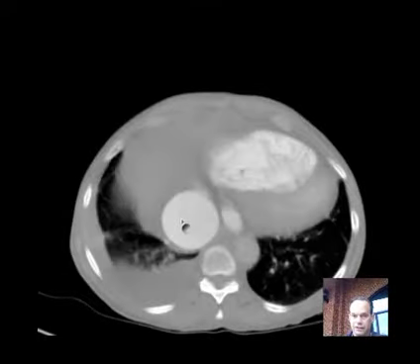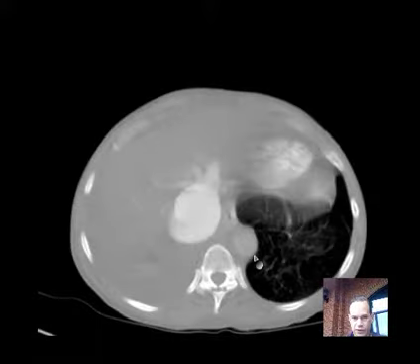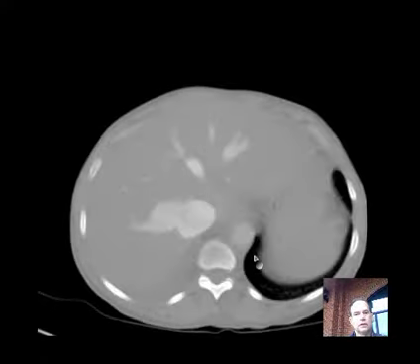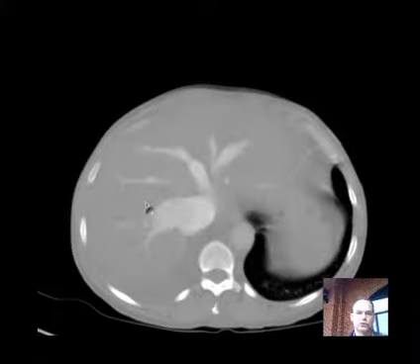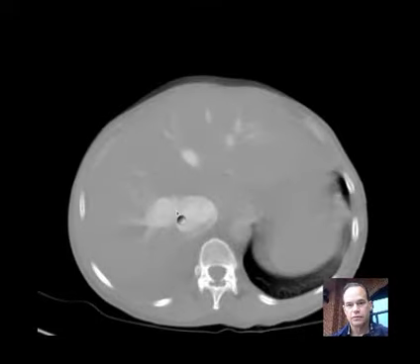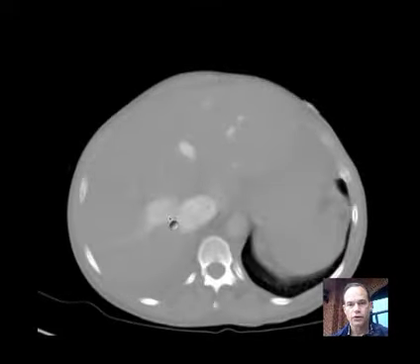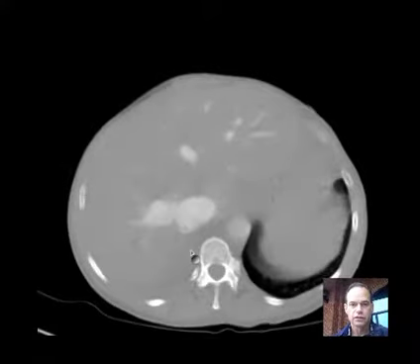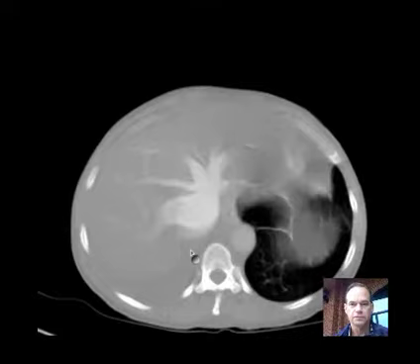I think you can tell that. It's 4 times as big as the aorta, cross-sectional area at least. And then if we go down farther into the liver, you see these structures. What are these structures? You should know at this point that those are not portal veins, they're hepatic veins. As we go from the liver here upward, you will see them here and here joining the inferior vena cava. So look at that. They're joining the inferior vena cava.